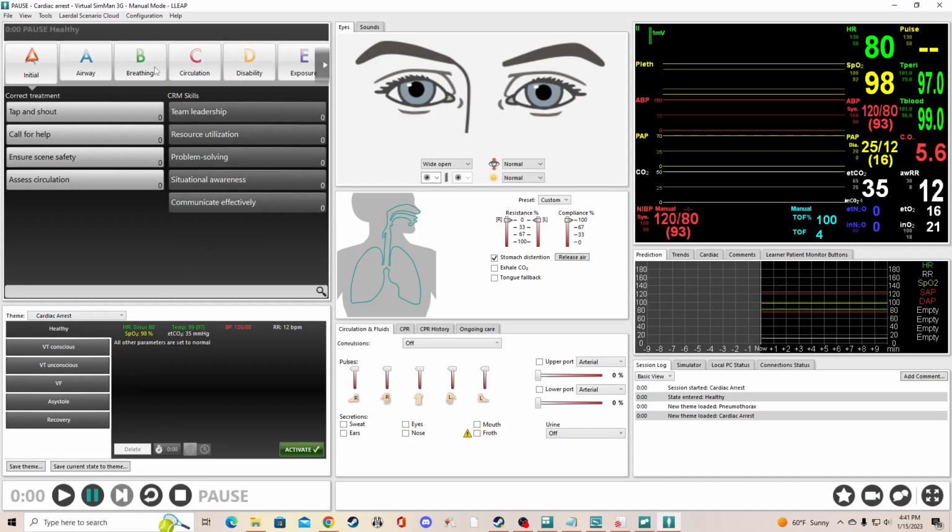So I'm just going to do a quick clockwise rotation here. Oh, another first thing is you probably have your view messed up right now. It has like a pole over here, which is what it had when I first looked at it. The fix to that is just to go to view. You can go to load layout and then reset default layout. You click that. That should make your view look like what I'm looking at right here.